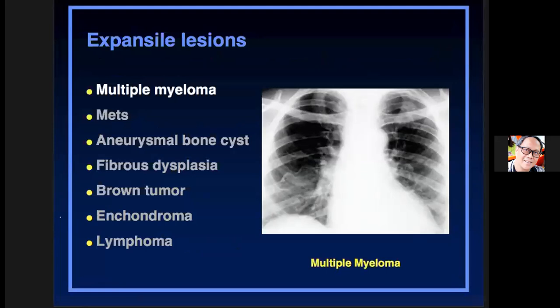Since we're talking about bone, of course you have to look at the bones. So look at the ribs. Is there any abnormal rib structure there? Anyone? Hello? You still there? Yes, doc. Can anyone tell me, the clue here, the abnormality is involving the ribs. Which rib is involved? Anyone? The costochondral junction, doc.